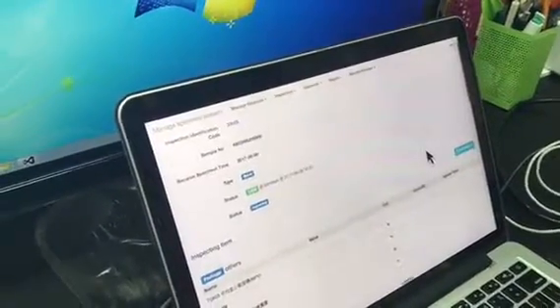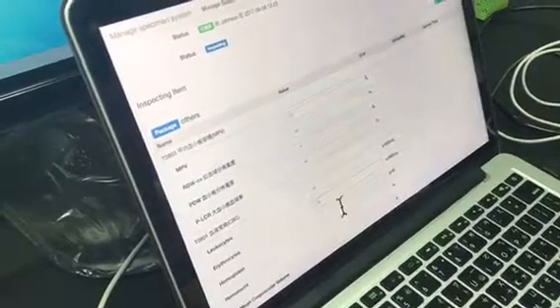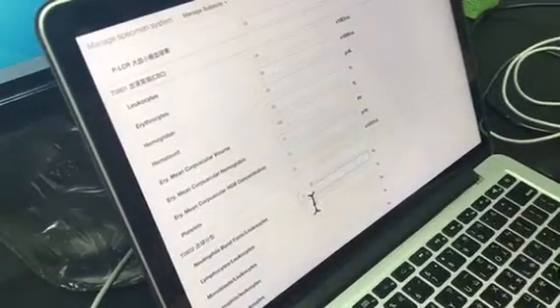So here is the test. You can see different kinds of elements for different kinds of tests. So in case, for example, we finished the test and we need to enter the result. You can have different element types, just like text, you can have positive or negative, or a number or anything.